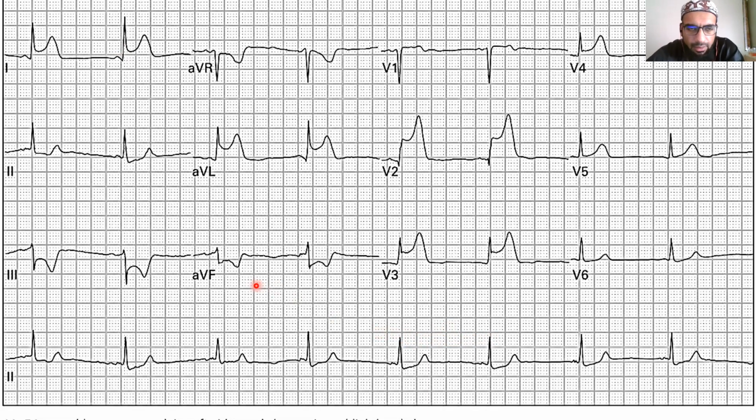The more important thing that I want to cover, and what my intention was when we did this lecture initially, was actually to look at the different zones. So I'm going to cover the different zones, and we're going to look at what we see. Now, I'll take you through the pattern that I normally follow.